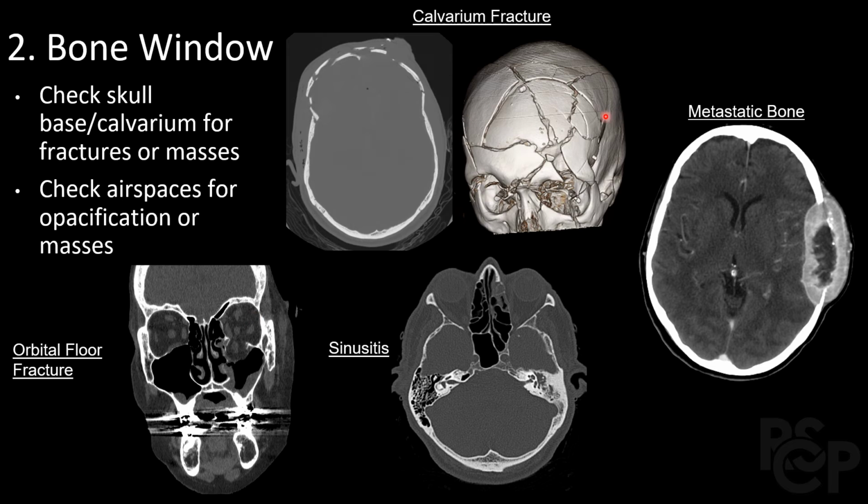If we look at this image here, there seems to be a clear multifocal trauma, likely corresponding to a comminuted fracture. And if you look at the 3D reformat, you get a better sense for how extensive the trauma actually is. Now, if we move on to the bottom, this patient has some opacification of their left paranasal sinuses, likely corresponding to sinusitis. And finally, this is a study ordered with contrast.